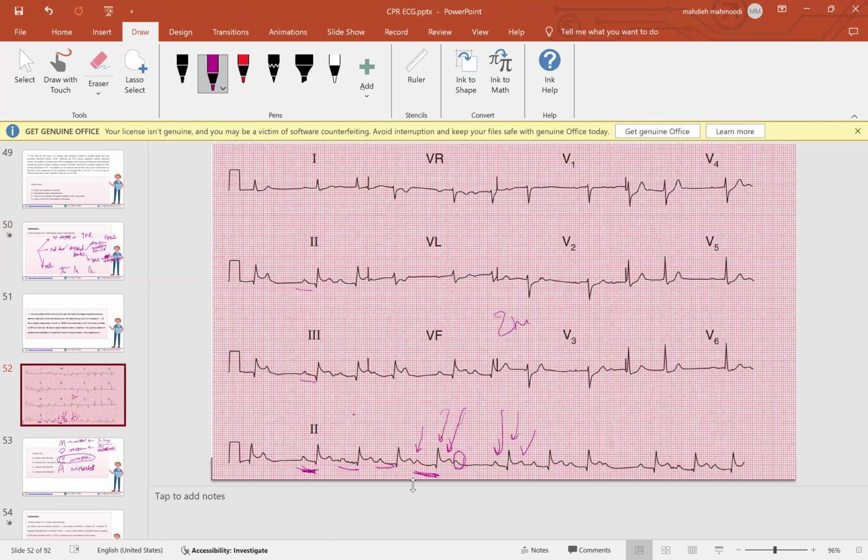Type 1 second degree. First degree. No, I mean type 1 second degree. Fine. So your patient has, excuse me, I was out of the content. There was some disturbance. I have seen the ECG right now. This is the inferior wall MI with progressing. This is a second degree AV block, second degree type 1, yes.